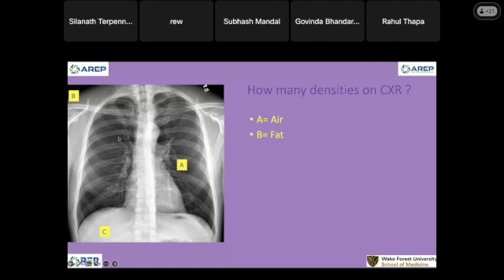Yes, it's close. It's a different structure. This is the aortic arch, but this is the aortic nipple. This is the soft tissue, the liver, and this is the spleen. Look at the CT. This here is soft tissue, the venous structure that is wrapping around the aorta. Fat is here, the fat plane.